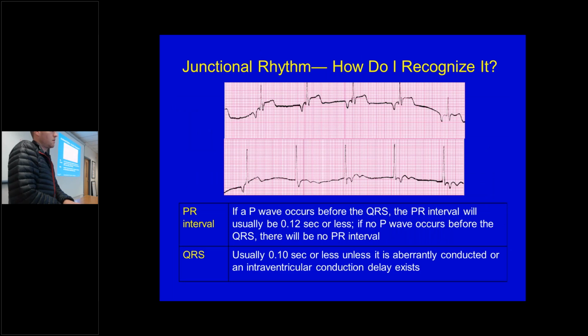What's aberrancy again? It's something that if we knew, we'd really impress the doctor. It's a wide QRS with a supraventricular origin, right? Normally a wide QRS would be a problem with the ventricle, like a bundle branch block. Sometimes you can get aberrancy. There's a wide QRS. Good.